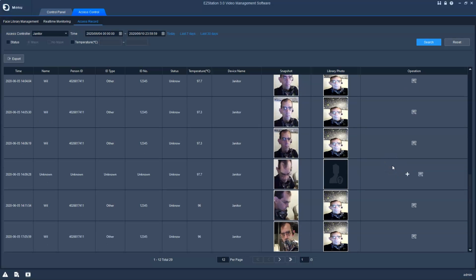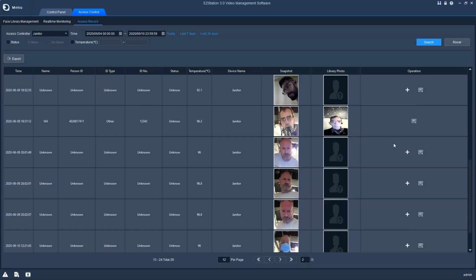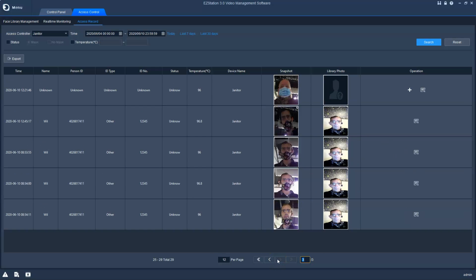To view more history, we simply hit this little arrow down at the bottom here, and that'll take us to our next set of records. And then we can scroll down and take a look at the records. And we can hit it again and take a look at the records more.